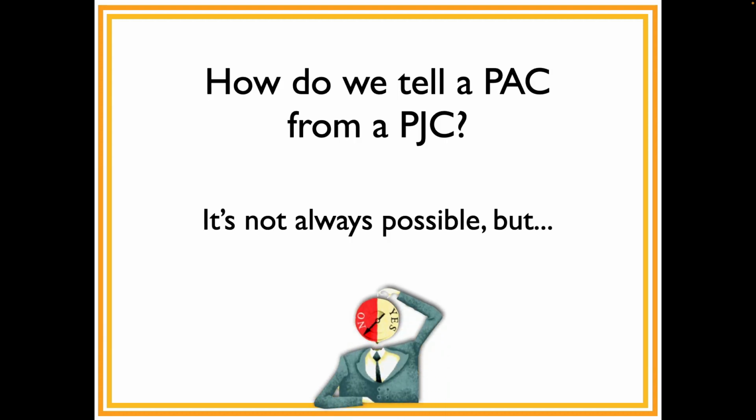Okay. How do we tell a PAC from a PJC? Sometimes it's not possible, but if we can, we should. Now, clinically, it makes no difference at all whether it's a PAC or a PJC. But if we can tell on the ECG, we should try to do so.